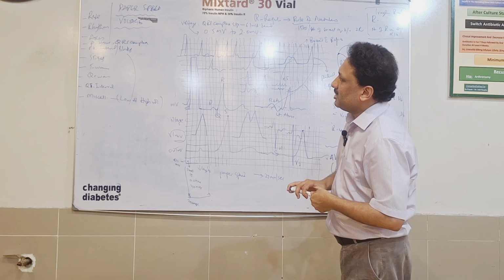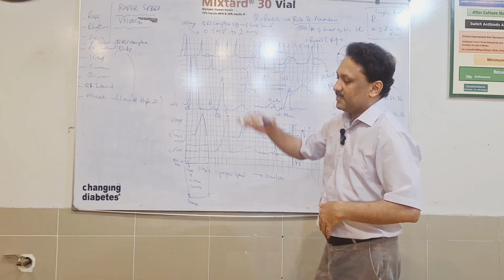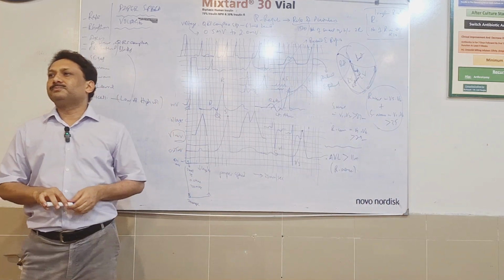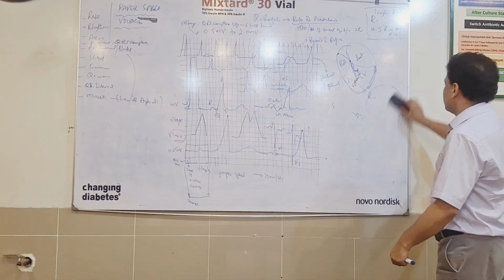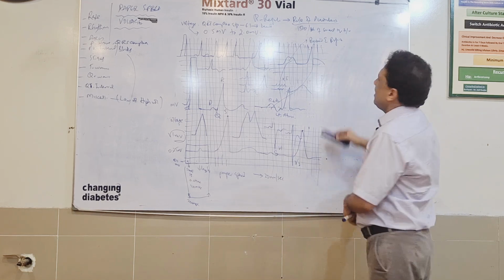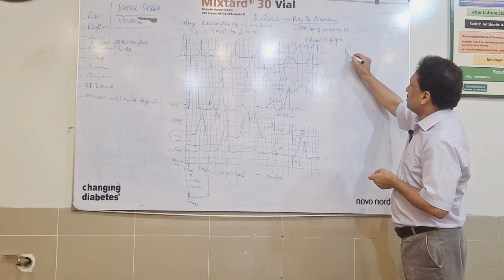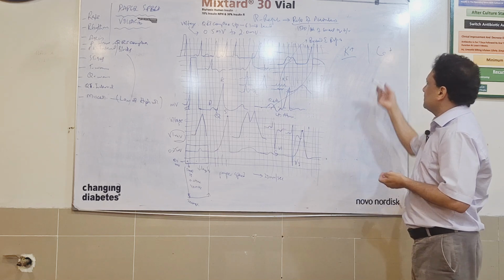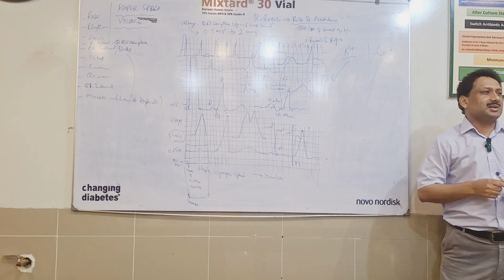So that's about ECG, QRS complexes, PR interval, blocks, ST segment. We have already gone through these last few things in the last 10 minutes. Electrolyte imbalance. How would you be assessing the electrolyte imbalance? Again, you are not supposed to focus on all kinds of electrolyte imbalances. We are just mainly concerned with potassium here, and I would also be telling you a little bit about the calcium changes.